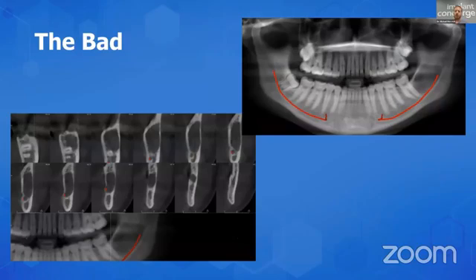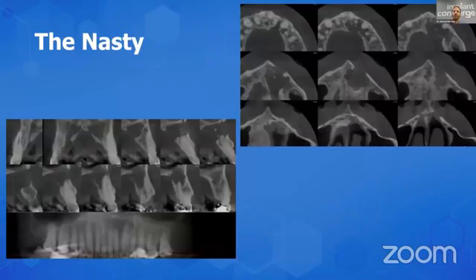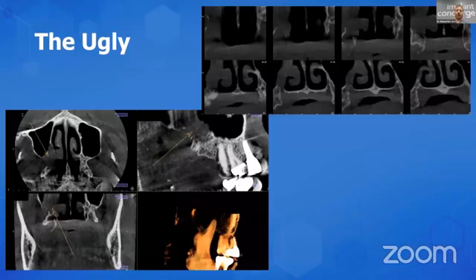So this one's really, really interesting. This is your OKC, for odontogenic keratocyst, but these I just found very recently. And often incidental findings. This one, most likely OKC. We can eliminate certain pathologies. It's not going to be your ameloblastoma. There's thinning of the cortical outline, but again, a really, really cool finding. And this was an incidental finding.